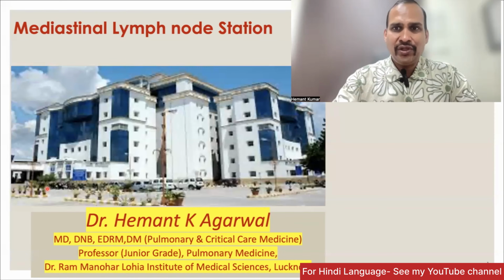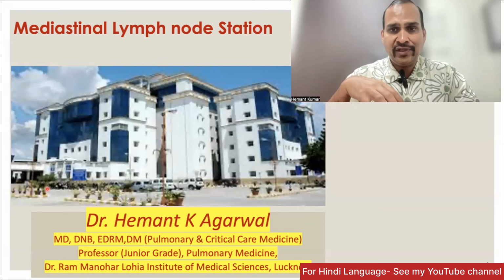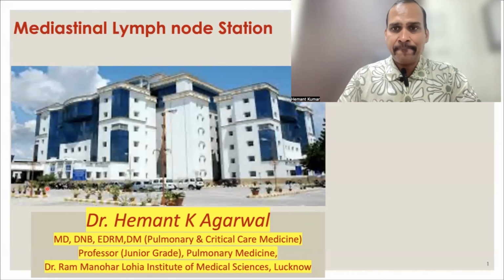Hello friends, today we will see one important topic, that is mediastinal lymph node stations. This is a very important topic for those who are managing lung cancer patients. It's helpful for diagnosis of the patient, to decide whether to use a TBNA needle or EBUS, and which lymph node should be targeted. It is helpful for staging of lung cancer and also for prognosis of lung cancer.